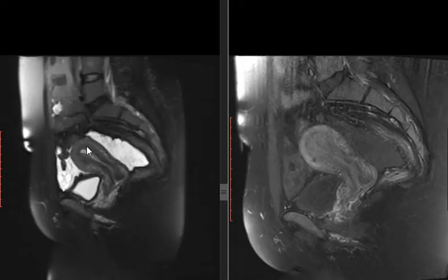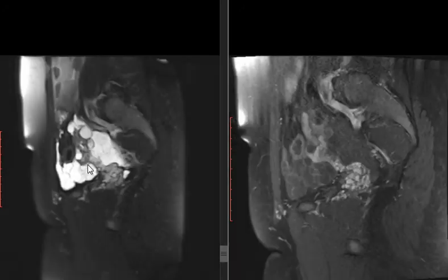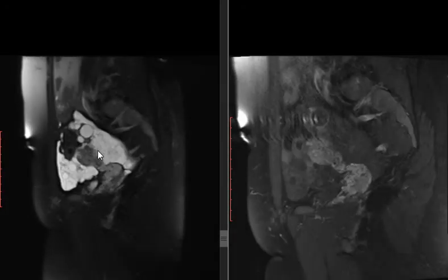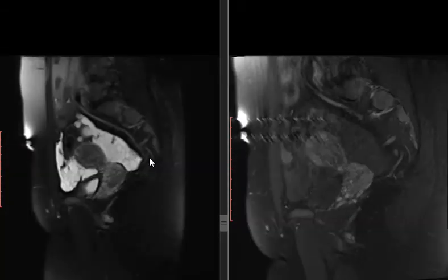Okay, Sarah? From the pelvic floor, you mean muscle? What do you say, guys? Some of them look cystic, not just like this one. Okay. Multiple cystic. So it could be something from the peritoneum. We are confused about the origin. Okay? From the peritoneum. Of course one of you said the origin correctly, but I won't tell you which one until later. Okay.